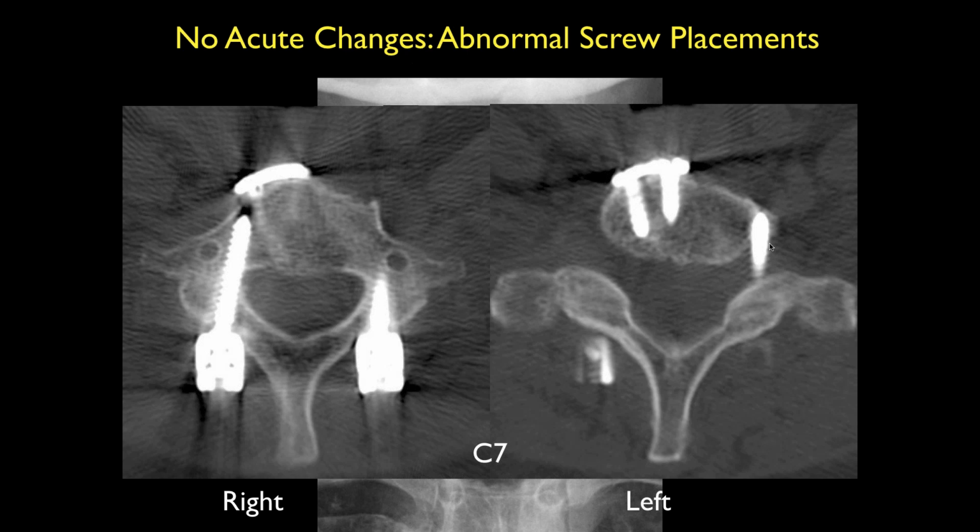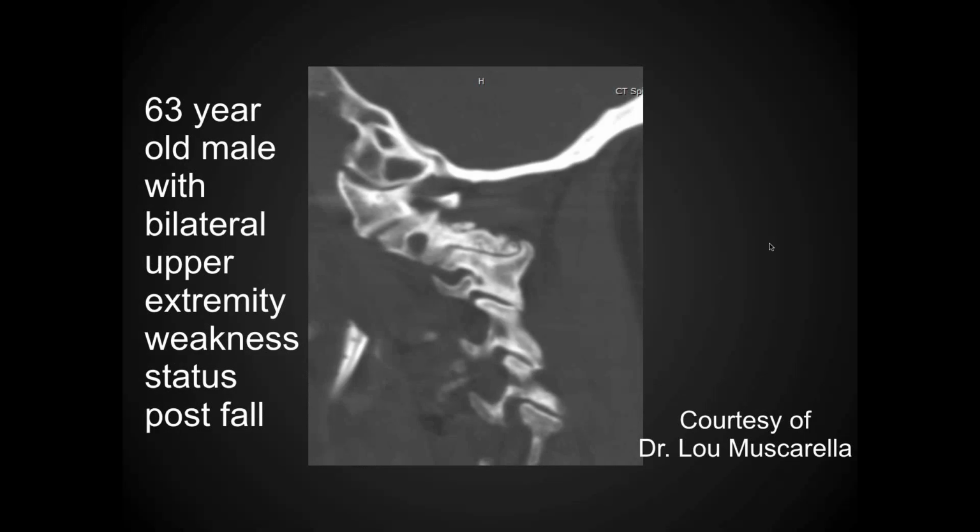Yeah. What you can say is this patient really got screwed. Okay, so this was just a problem with positioning of the surgical devices. Okay, Sam. You're being kind, John. Thomas here, the last one. Right? I think so. Yeah.